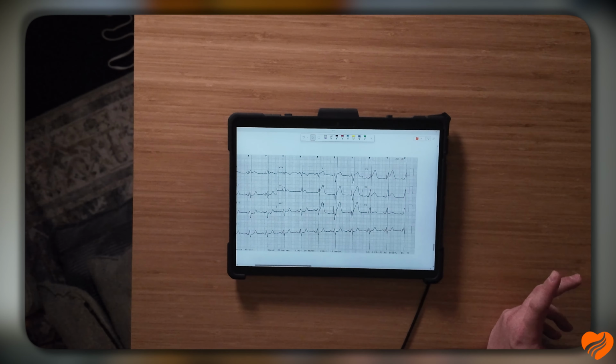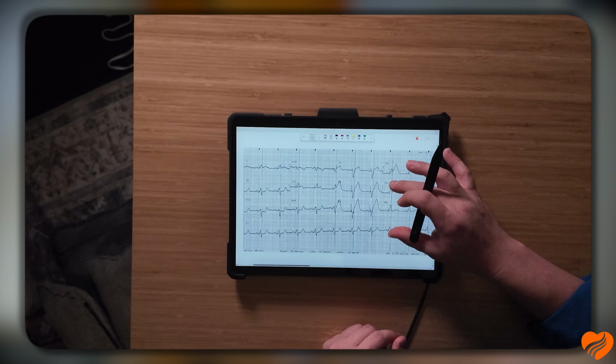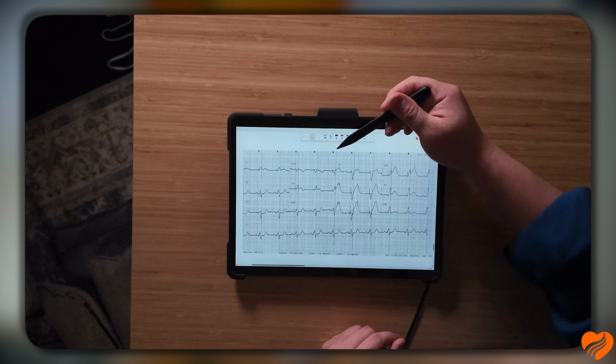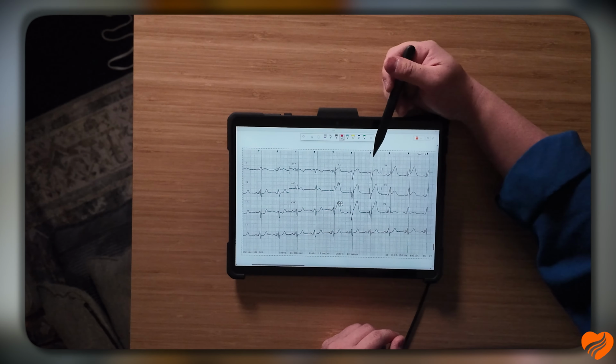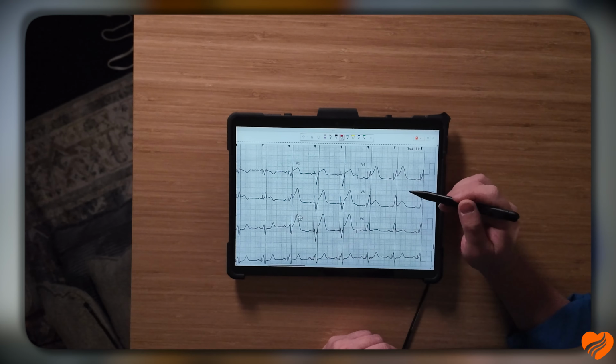All right, so let's look at our final 12 lead example here, okay? So let's see here. It's wide. I see pacer spikes. This is obviously a paced rhythm, right? Now, right off the bat, I can see concordant ST elevation in about 2 leads, it looks like.